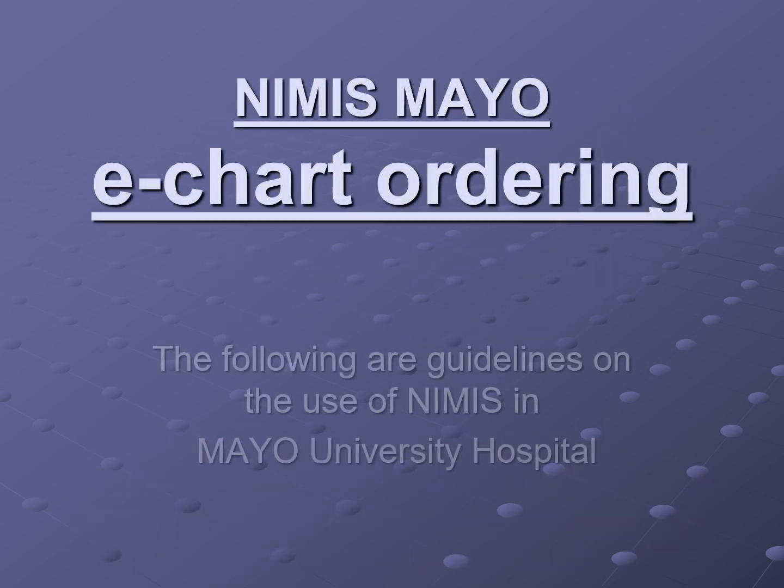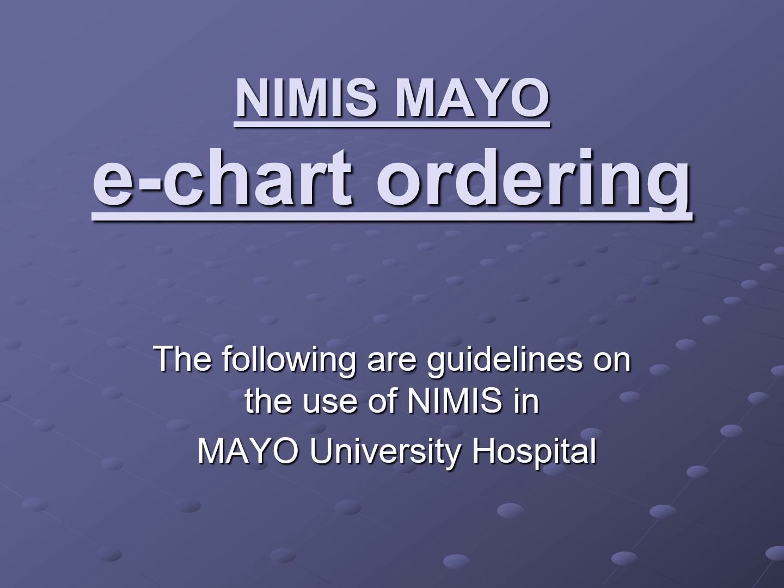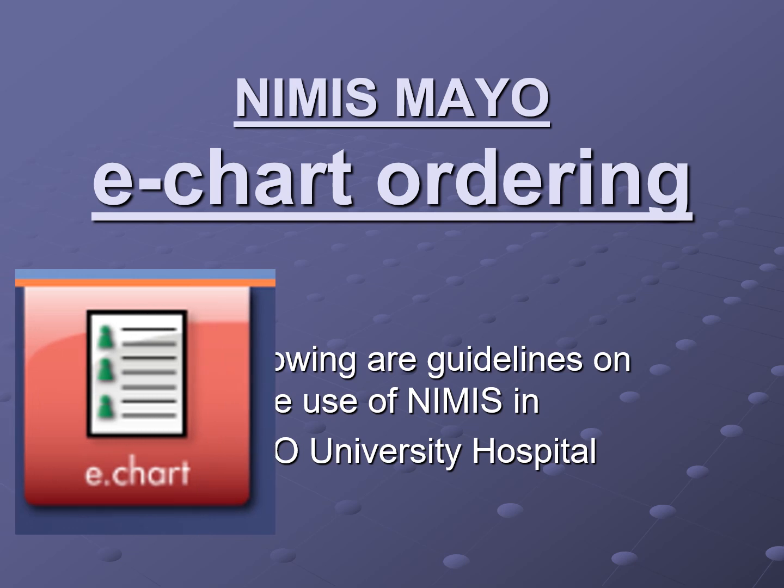Welcome to the NIMIS eChart ordering training session. NIMIS is the National Integrated Medical Imaging System. NIMIS is tailored to the requirements of the specific hospital. In Mayo, we use the eChart module to access the radiology information system. We use it to request examinations, view the status of examinations, and read reports.